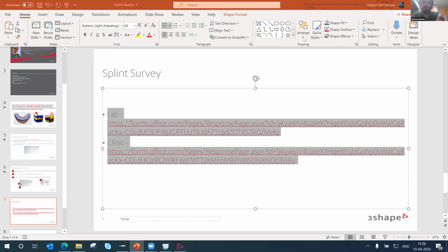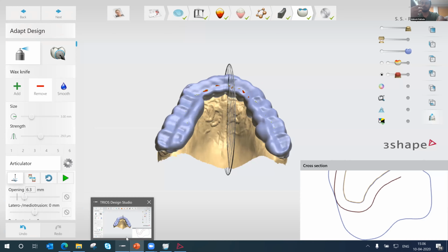Arjun Verma asks, how would you design occlusal point contacts on each posterior tooth in ICP with the splint in the mouth, for example when fabricating a Michigan splint with canine ramp? Arjun, I feel like this is something I could have answered while designing. What I understand is you want to design some high points, occlusal points, exactly where you want them. Here, if I'm understanding you correctly, we have the option of adding material.